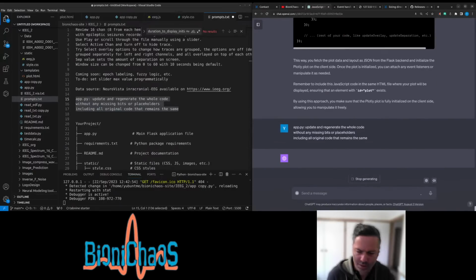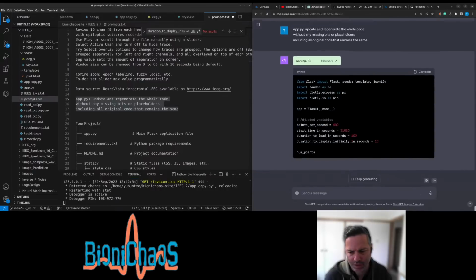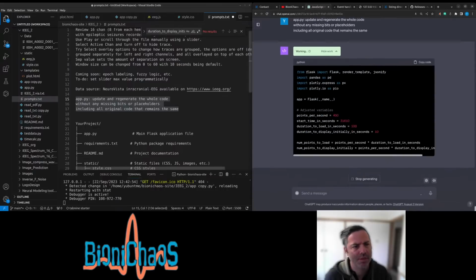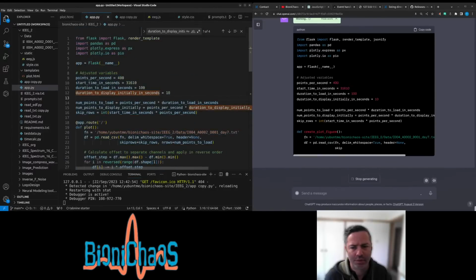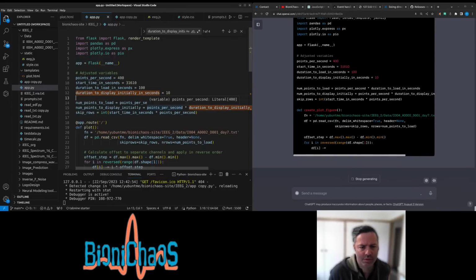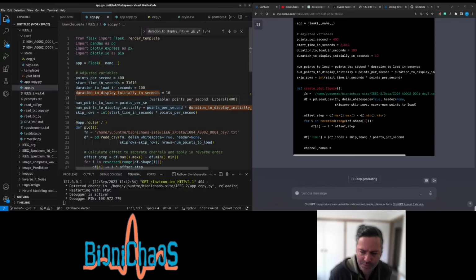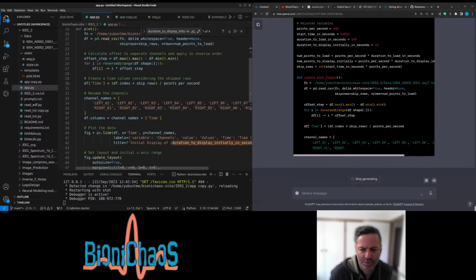Let's see if it's taking a, oh come on, it's still doing stuff in the browser. But it's doing it. You can copy it from here. Channel names look correct.